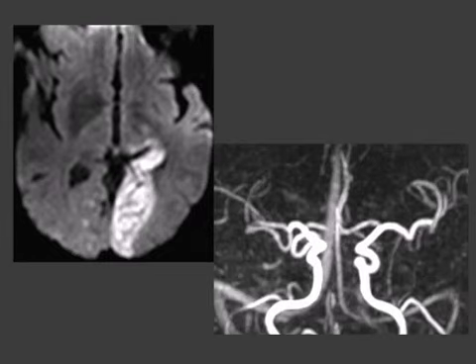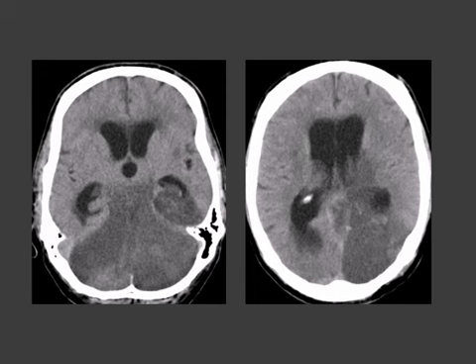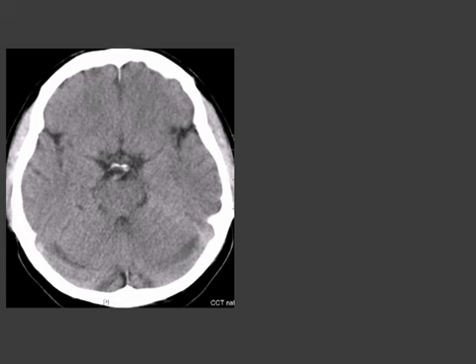This patient was brought immediately to MRI, where you now definitely see that there is already cytotoxic edema on the left side, and on this MRI you don't see the basilar artery. So I think there is no discussion what it was, and this is the next day, with extensive infarcted areas in the posterior fossa and midbrain. This was a typical case, or a case that was pretty easy to diagnose, of a basilar artery obstruction.